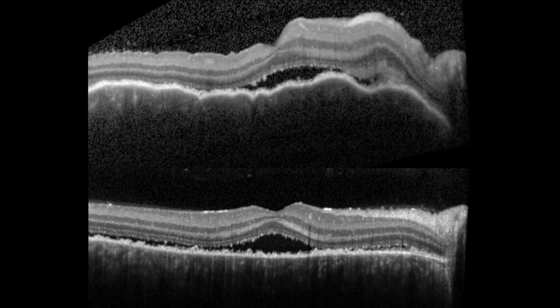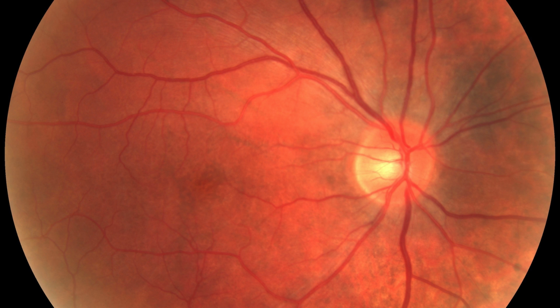This is a disingenuous first OCT for me to show you, because this was not in fact his first OCT. But you can see the subretinal fluid here, some drusen-like deposits overlying the RPE, and 1 month prior he presented with many chorioretinal folds, a thickened choroid, diffuse subretinal fluid, although it doesn't show up in this OCT, and he actually had Vogt-Koyanagi-Harada syndrome after an extensive workup. This is his sunset glow fundus, although best appreciated on clinical exam when you get a slit beam that scatters once it hits that atrophic RPE and gives you that glow.